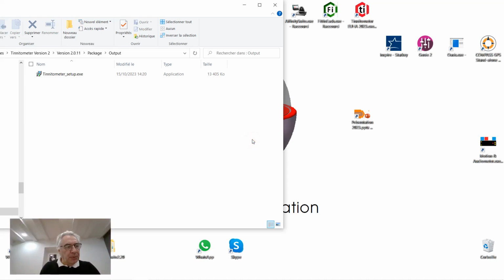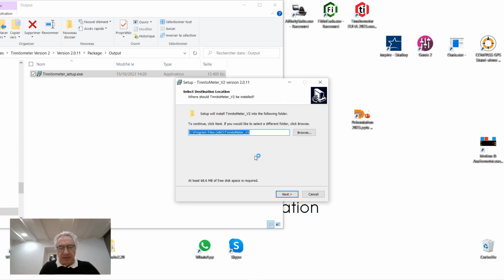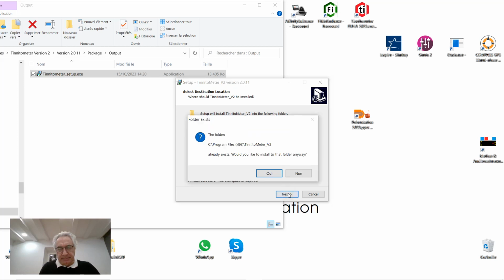I will show you how to install Tinnitometer V2. First, you launch the installation, you download. Say yes. You can ask for English. Say okay. Next.